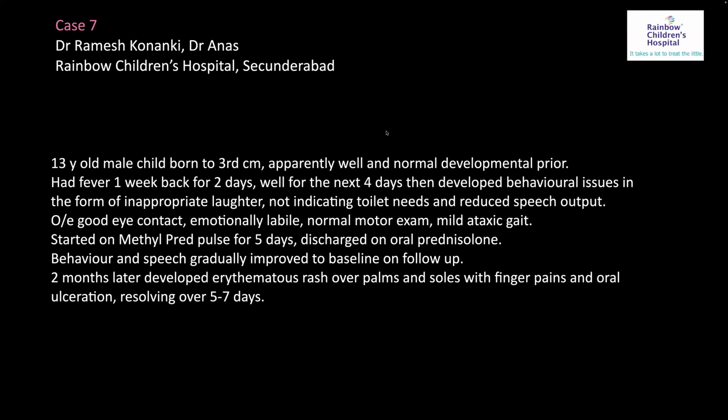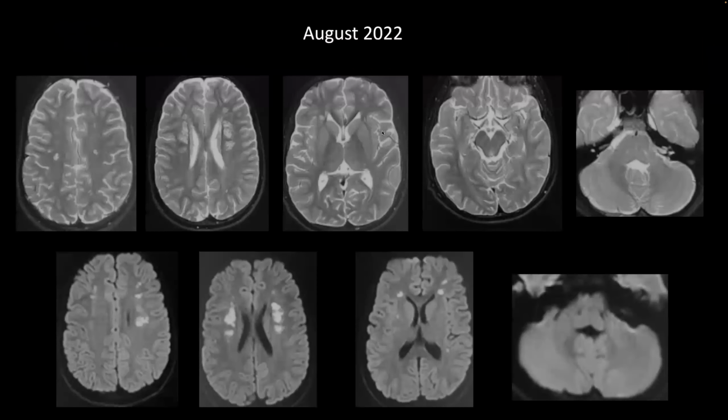Okay, so this child has 3 sets of MRIs. So I'm assuming that after the first MRI, you started the methylpred. Is that right? Yes, sir. Okay. So we'll have a look at the MRI. So this is in August 22.